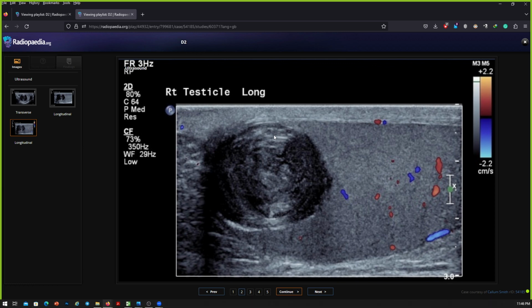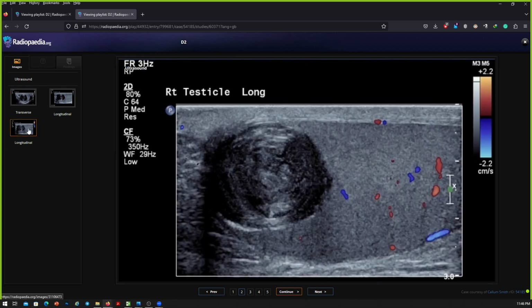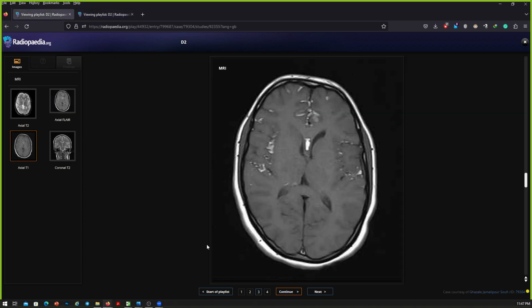And even if you're finding this to be very much benign, which I agree, you have the Doppler along with the ultrasound. Always say that you will do the Doppler. You'll put color and see the lesion just to confirm, just to be sure, just to be safe. RCR is actually looking for safe radiologists. They are not looking for someone who's very hi-fi or someone who's a super specialist in any field of radiology, but they're just looking for someone who is safe. So we have to be safe radiologists first. So even if a normal practice will always put color, please do that. This again, very well done.